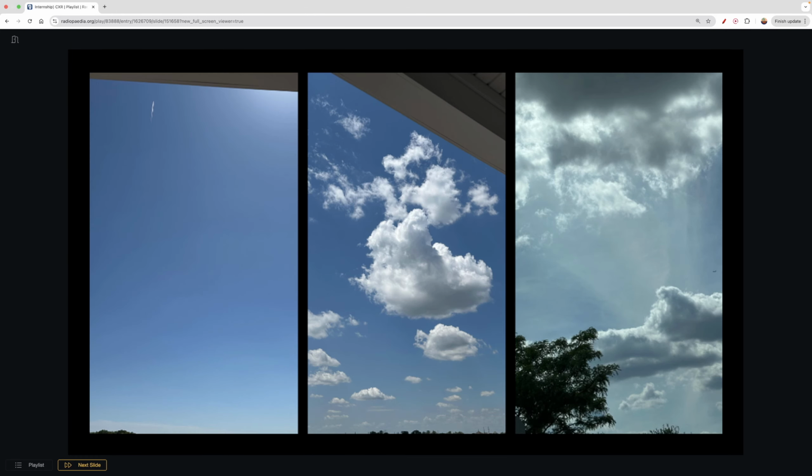So first, let's take it to something that we actually know, something that's not abstract. So these were photos submitted to the Nat Geo Photo of the Year gallery by yours truly. And so this is a picture of the sky, right? We know what the picture of the sky looks like. It's not too confusing, okay?